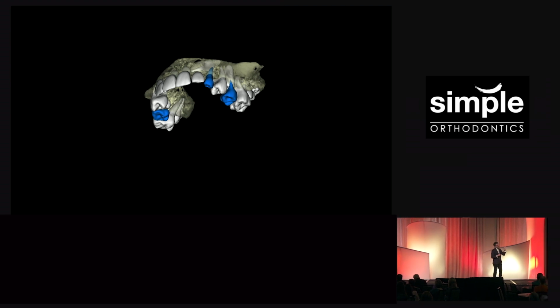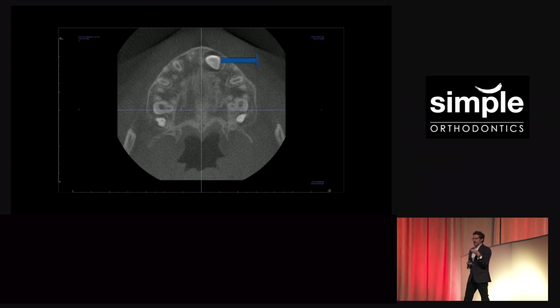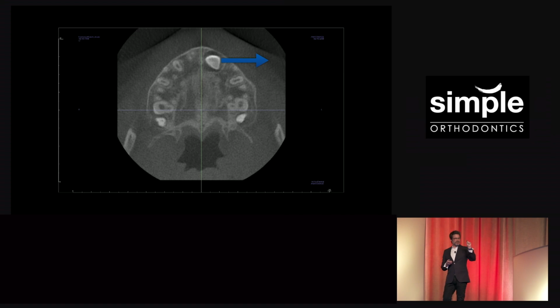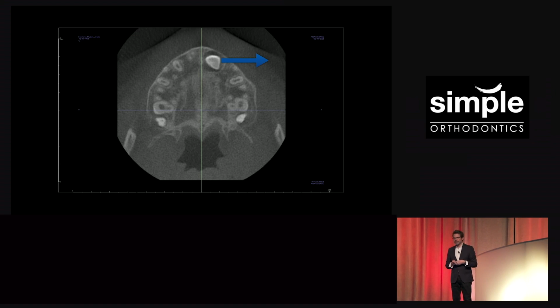And all that bone that's on the buccal of that tooth has to go. Here's what it looks like on the axial slice. This is where I want to go with that tooth. So anything that's gray in there, notice the eruption follicle, all that radiolucent area, all the gray around it has to go. All the cortical bone on the outside has to go.